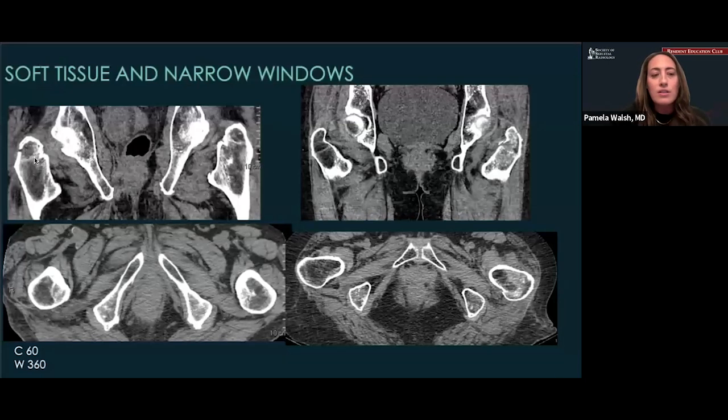So let's take a look at these intertrochanteric regions because we have our greater troch fracture. So we need to answer the question, is there occult intertrochanteric extension? Is this patient potentially going to need to go to the OR? So here we see in our medullary spaces, these are coronals through the intertrochanteric region, and here are axials through the intertrochanteric region. They look pretty similar with regards to their fatty marrow.